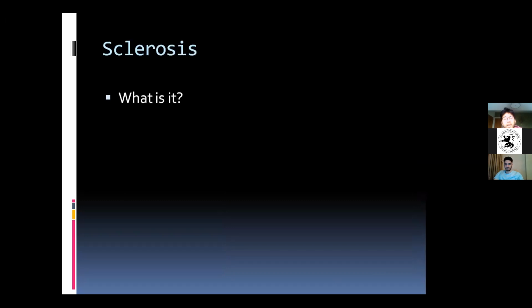Okay. Right. Sclerosis. Now we're getting into more about the density of the bones and whether or not there are systemic conditions. What is sclerosis? Yeah, if you're a man, for sure. So what is sclerosis? Bone buildup, hyperdensity. Well done. Okay, what can cause sclerosis? Now, I just want you to think about the broader causes, not just focusing on one specific pathology.